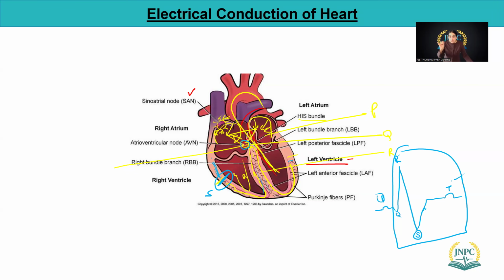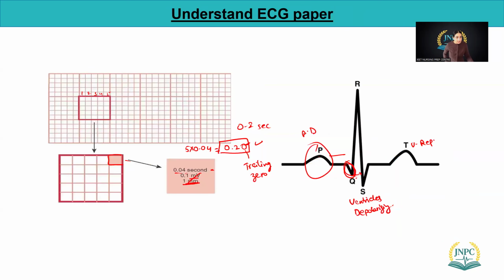So now we can actually see that in the ECG tracing, if you go back, PQRST, now we can relate when P is forming, when QRS is forming. Tanya, is ventricular depolarization and atrial repolarization occurring at the same time? Yes, that's correct. But we cannot denote atrial repolarization on the piece of paper because ventricles are super important. We want to see their ventricular activity. So at that time, when ventricles are contracting, atriums are relaxing. We cannot see it on the ECG paper. That's the thing.